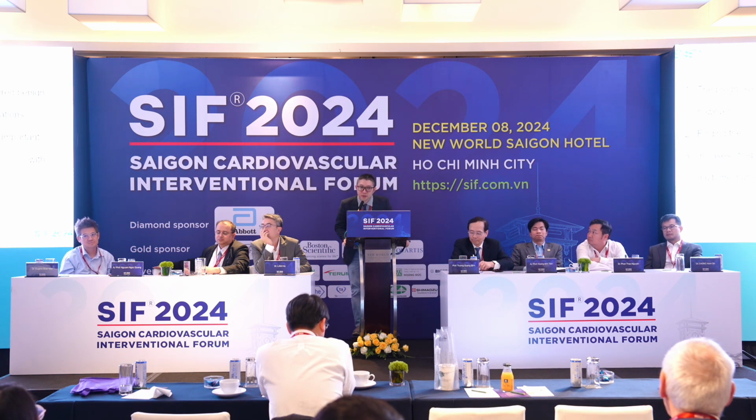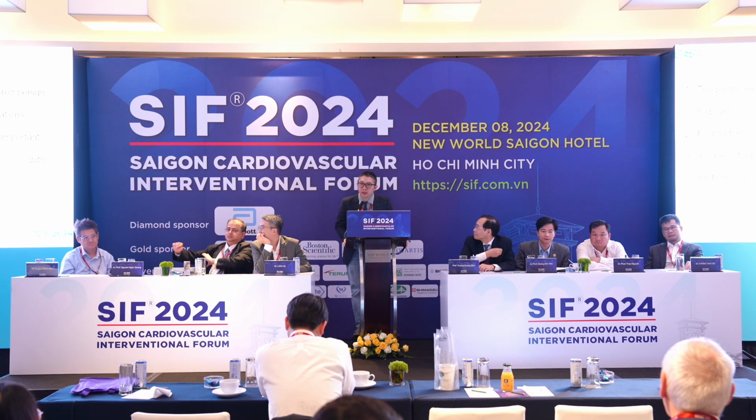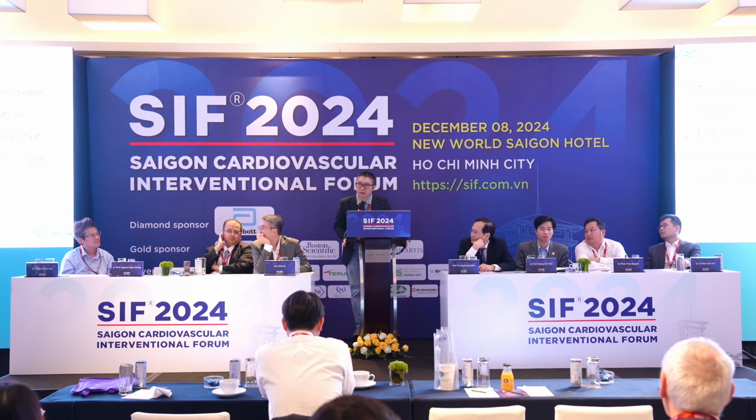Thank you very much. It was my concern after the case to redo the CAG for the third time, and I also checked the echo at the table very strictly, did the EKG, and monitored the patient. But I predicted it would not change much, so that is why I decided not to do the test again. Thank you very much.